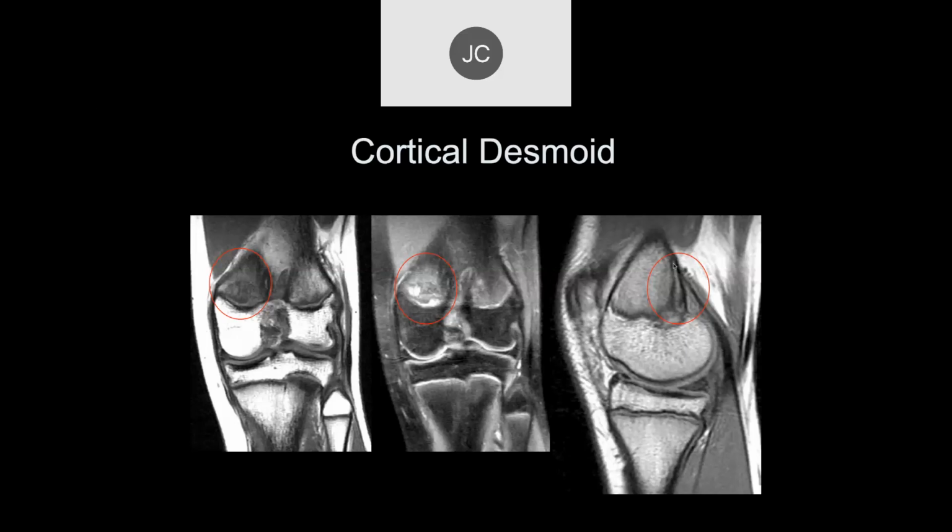It's unlikely that it's an osteosarcoma, especially where there's no mass and no periosteal reaction. This does not look like a malignant lesion. It's not going to metastasize and kill the patient if you wait 6 weeks. Within 6 weeks, the healing will go through the healing phase, and at that point, if you biopsy, it will not show such bizarre cells.